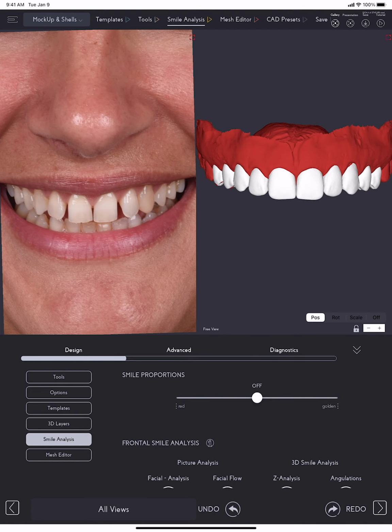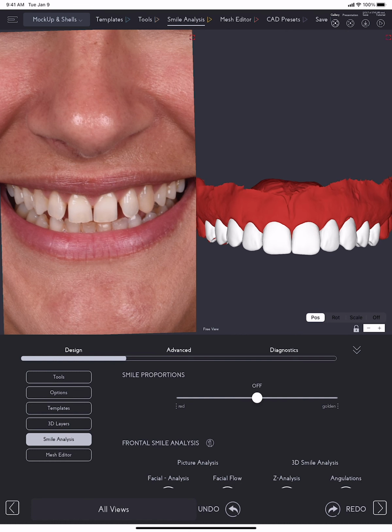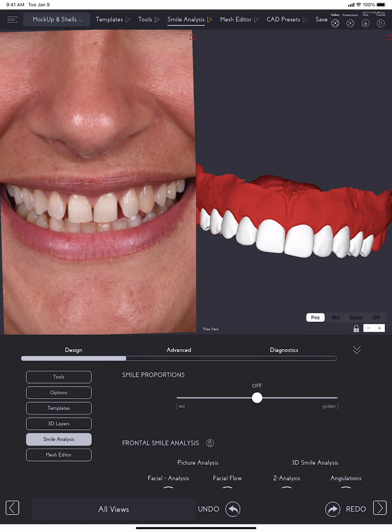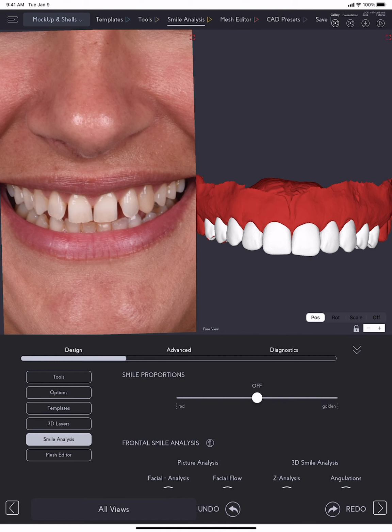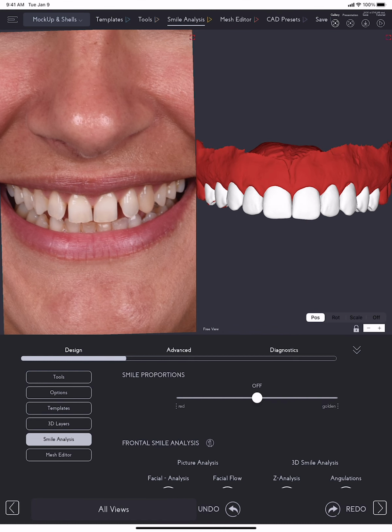So I'm going to turn my object, my design and the intraoral scan into a frontal position. That's very important, in the frontal position, because the smile analysis is a frontal position, right? So you see, we have some things that we can improve and we are going to improve, but with the visual analysis the design is okay.